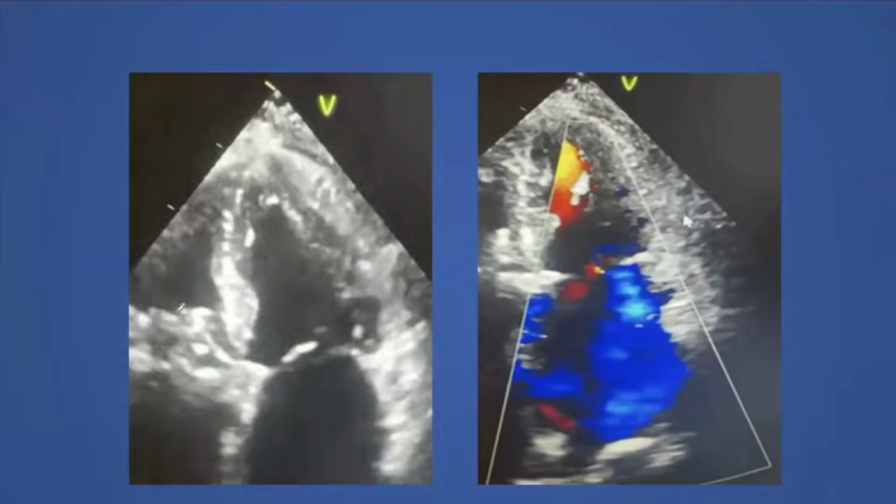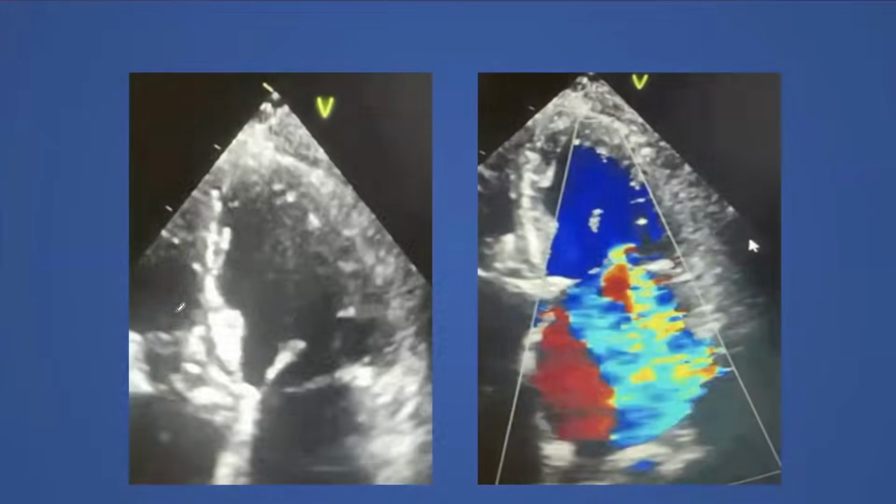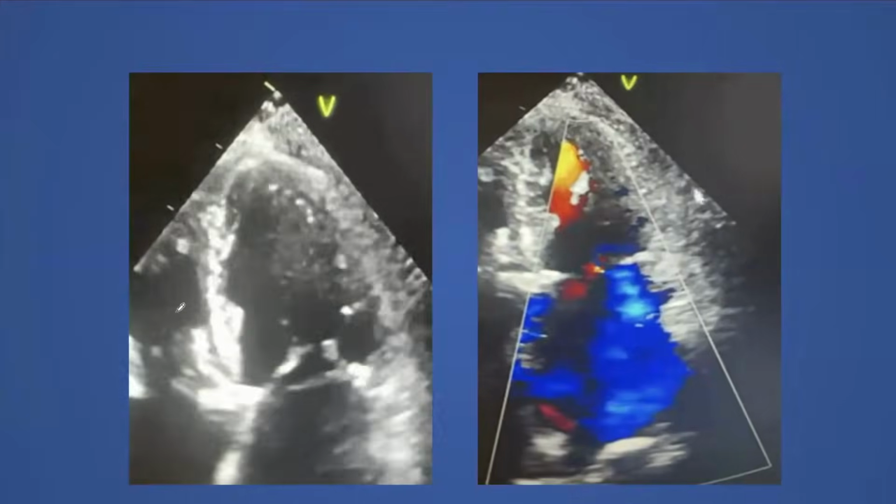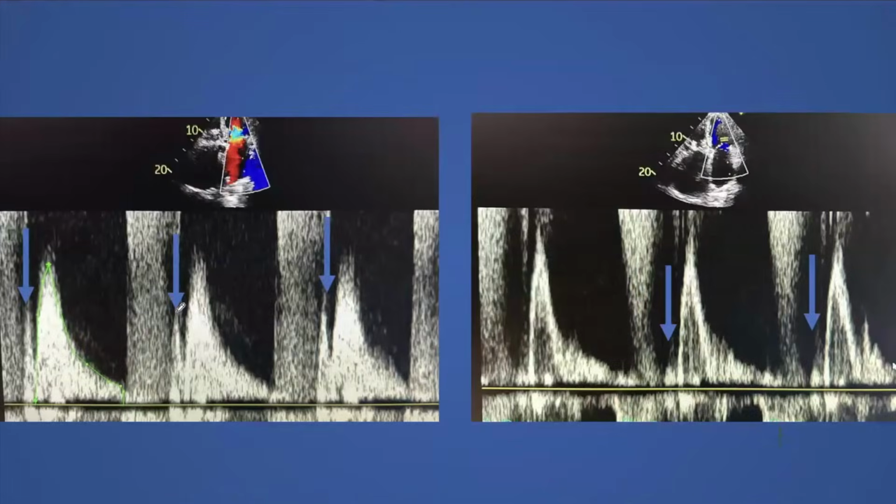Essentially, with that Doppler profile, you're seeing flow towards the apex before the mitral valve has opened. Yes. That's your point here, right? Yeah. So the explanation is that the ventricle relaxes, it sucks blood towards the apex, which causes this profile before the mitral valve has opened.